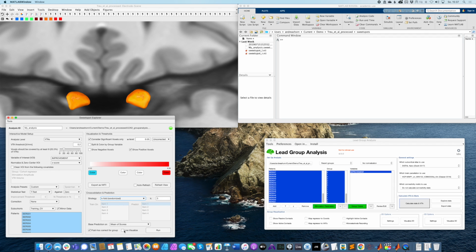We could even say that we want to live visualize this. So during cross-validation, we want to see how much the model changes. I'll now do this on all the data, and we will just test this, and maybe we'll just take 3 folds.